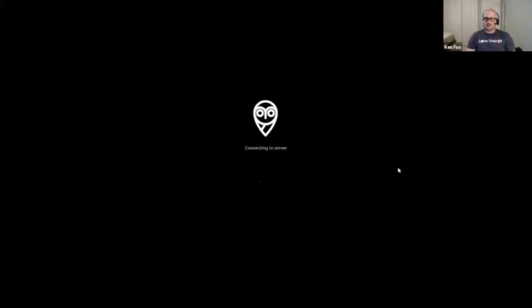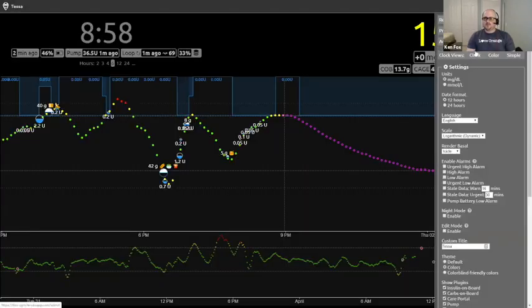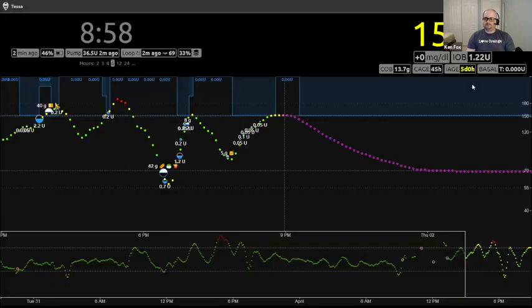There we go. So there's a couple of different clock options here. I forget what the other ones are. This one's a little more subtle with the actual time on it. Yeah, okay, clocks, those are fun. You can imagine all kinds of fun things you could do with it.